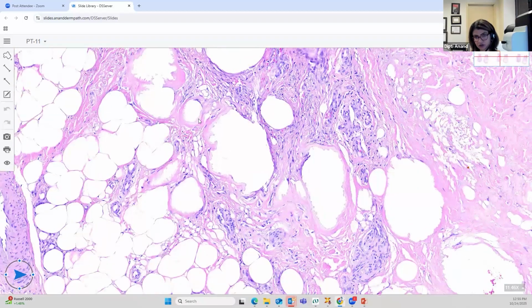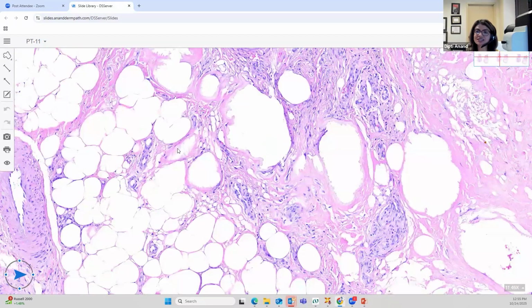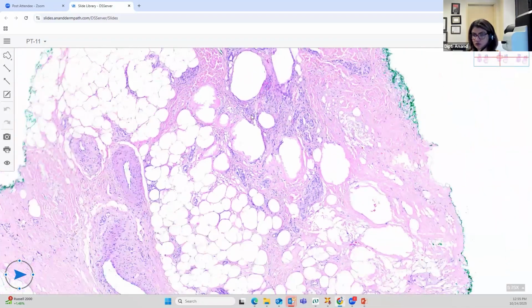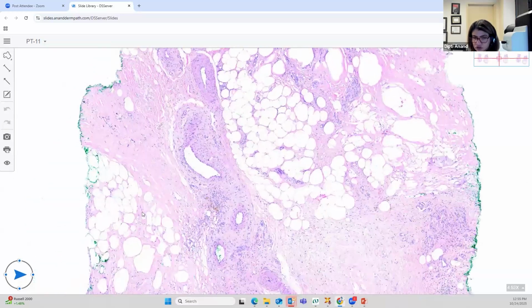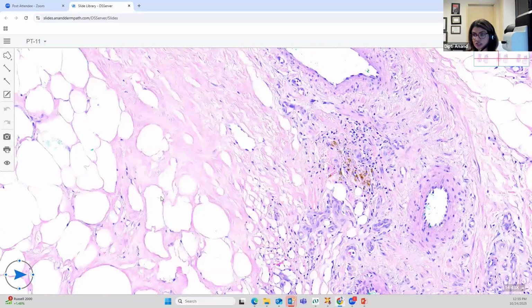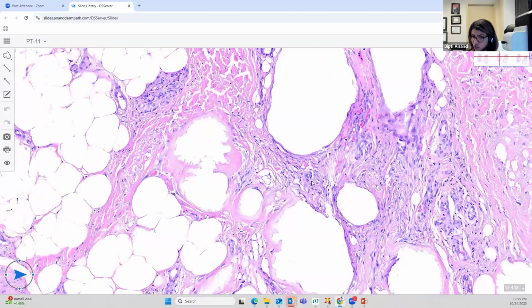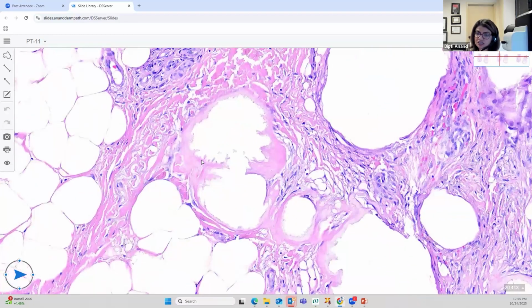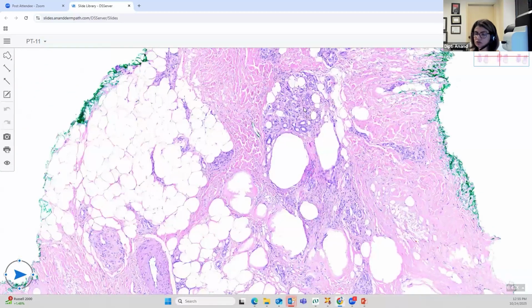So what is membranocystic fat necrosis? It's this pink fat necrosis where the fat, again because of ischemia, is dying off at variable speed and variable sizes, right? So you get some really big fatty spaces. You get some really tiny fat. So you can see here tiny fatty lobules. You can see big fatty spaces. Some become really big and undergo this cystic change. And then classically, you see this feathery fat necrosis. This is the ischemic membranocystic change, which is classic of lipodermatosclerosis.